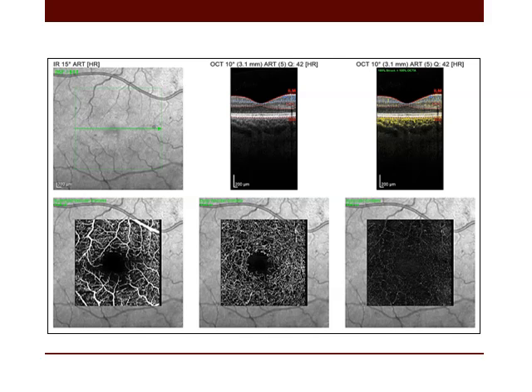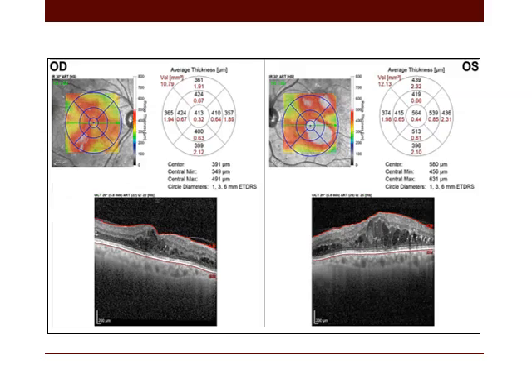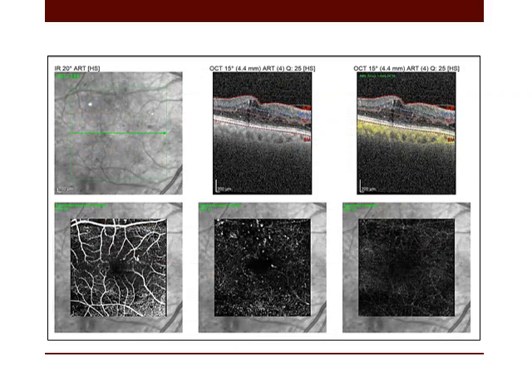In diabetics, it is important to perform OCT angiography because most of the ischemic changes occur in the deep vascular plexus rather than the superficial one, and it precedes it with larger ischemic changes, as you can see here in the deep vascular plexus, and no evident changes or no marked changes in the superficial. We could detect the presence of many hyperreflective foci in the deep vascular plexus and ischemic changes. Why these hyperreflective foci? They are due to microaneurysms.